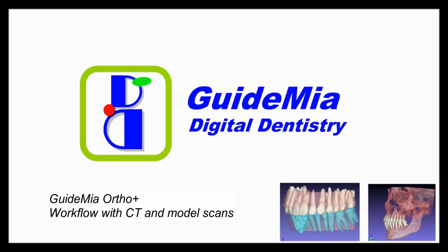In this demo, we will use GuideMia Ortho Plus software to perform treatment planning and aligner design. The case has patient CT scan, model scan, facial scan and X-ray panoramic picture.